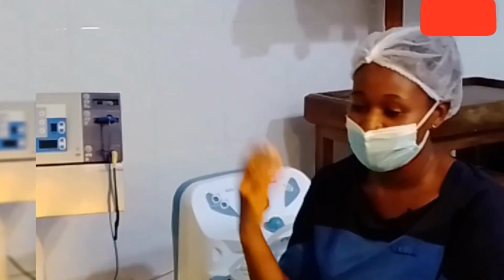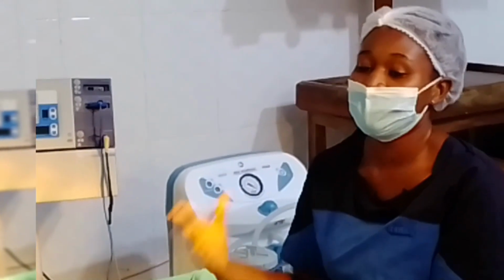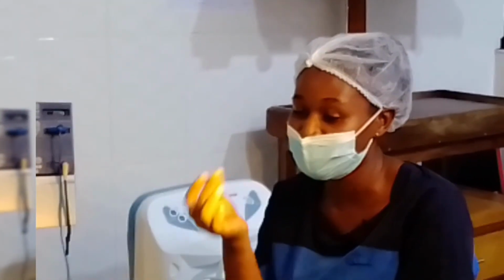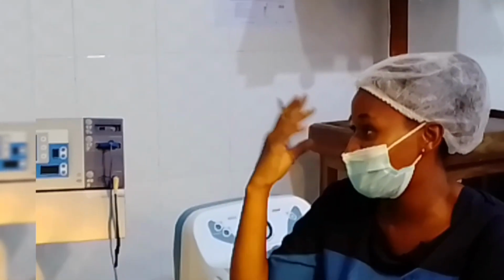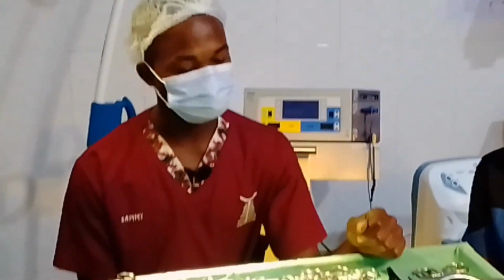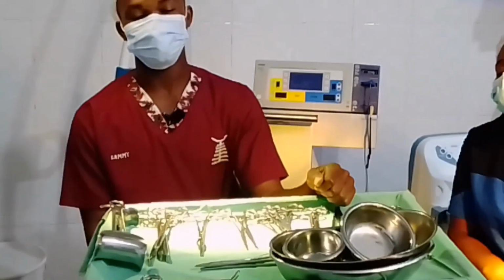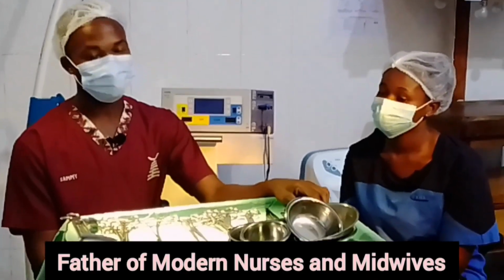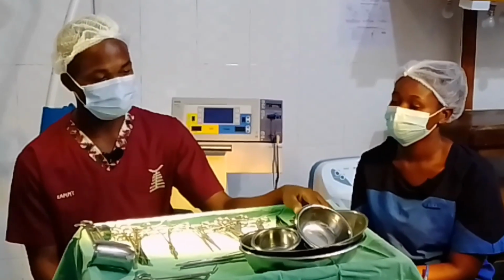I'm sure a lot of people, student nurses, midwives, and even some tutors will be enlightened about the things that you're going to teach us here. So let us know their uses and anything at all that you want us to know about the instruments. Okay, thank you very much. As you rightly said, my name is Samuel Edututu, popularly known as father of modern nurses and midwives. Today we are going to learn some basic surgical instruments and their uses.